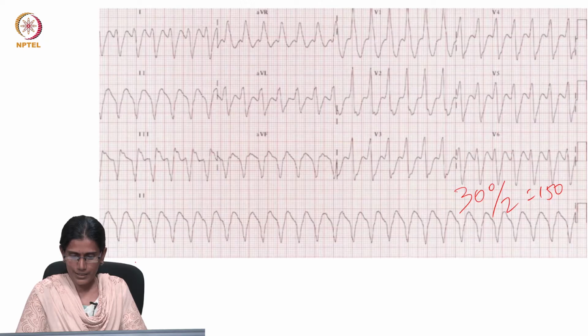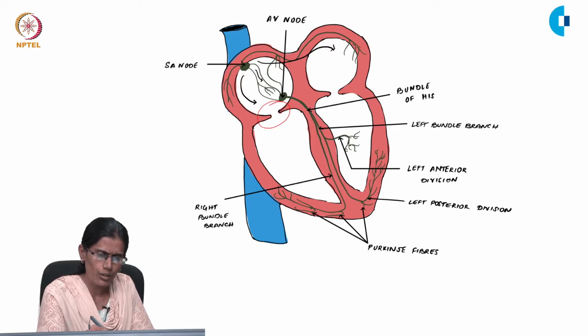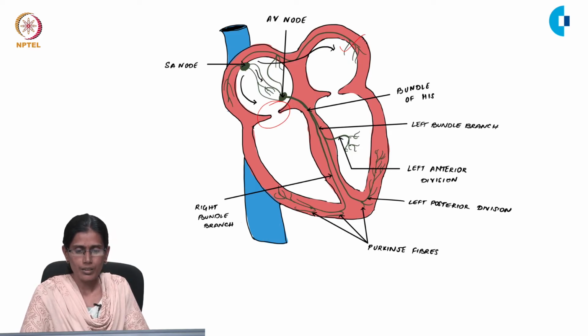We are going to analyze this ECG in a stepwise manner to find out the rhythm. This image shows normal impulse formation and conduction. Tachyarrhythmias can happen if there is a problem in impulse conduction. Usually there will be re-entry. There will be circus movement of the electrical activity around a part of the heart, for example, around the tricuspid valve annulus in atrial flutter. It may also happen if there is a problem in impulse formation. For example, if the subsidiary pacemakers, for example in the atrium, start firing at a rate higher than the SA node rate, you come across tachyarrhythmia.